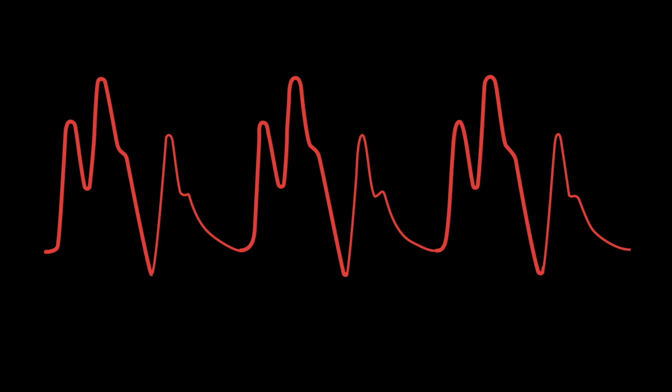Systole is trickier. The assisted systole actually occurs right after the balloon deflates, so it's during this thinner curve when the balloon is not doing anything. And that means unassisted systole is actually this peak here. As you remember, the balloon will still be deflated during systole and only inflates during diastole.